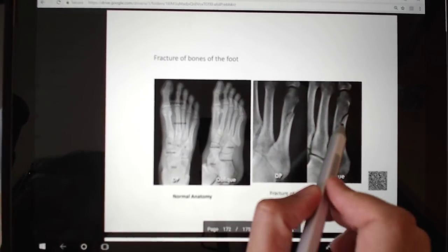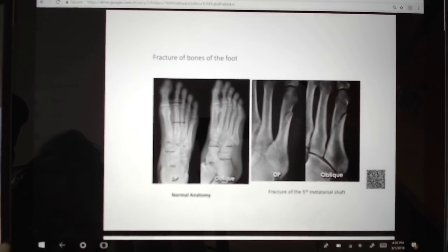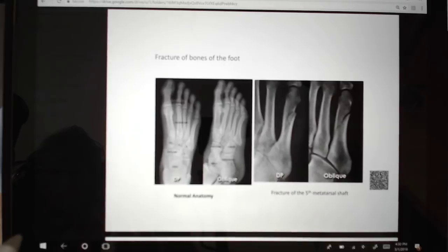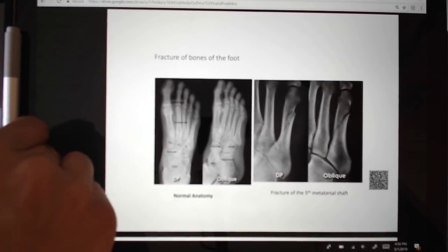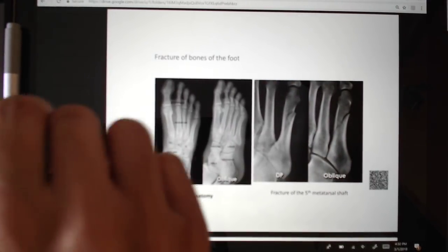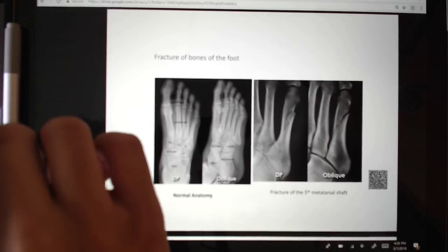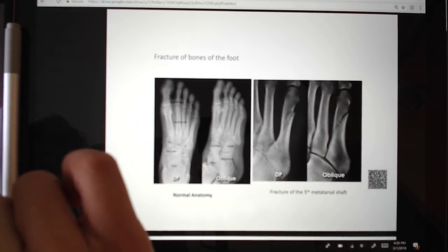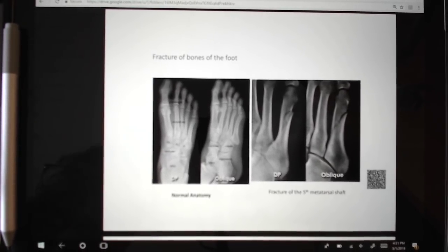For the most part, look at all this stuff. This is what they're going to give you. As far as the transverse CT scans, they can just give you blood vessels and things. Blood vessels are always going to look like tiny little circles. You just have to know where they're located in relation to each other. For example, your vena cava is going to be on this side, your aorta on that side. And make sure you don't mix it up with an esophagus or something. That's pretty much it.